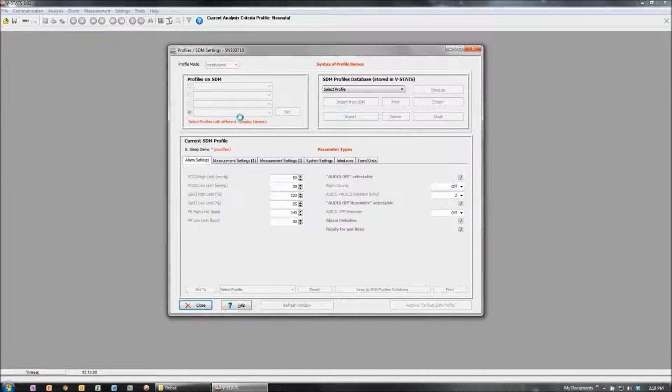And you'll notice now that our machine, if you look on the screen of the machine, you will see in the top left-hand corner, it actually says new profile vid. And that's how we set up profiles. As I said, you're going to have 4 profiles hot swappable on the machine. The best way to get to the profiles is to hit the enter button, which is just a quick access menu button. Really, when you hit that once, it's like hitting a right mouse button, and then go to profiles on that screen. It'll bring up the profile straight away.